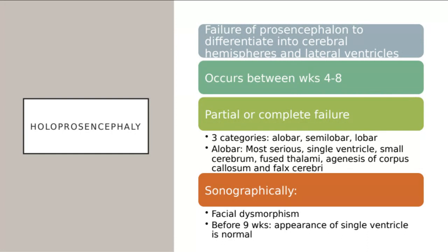So depending on where in that brain development we are looking, we're going to have different sorts of anomalies that follow that section when the baby is developing. Now, one of the things that you may actually be able to see in a very early first trimester ultrasound is the rhombencephalon. If you've done a first trimester ultrasound, and you're working on a beautiful machine, you should have definitely seen a rhombencephalon.